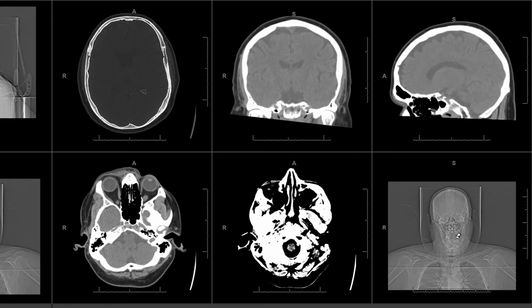You're trying to optimize what's in the field of view of your fovea. Remember that for the sake of imaging, we don't see things in our peripheral vision. Peripheral vision evolved to see tigers lunging out at us, not at lung nodules. You want your fovea to see as much of the image as possible when you're scanning.